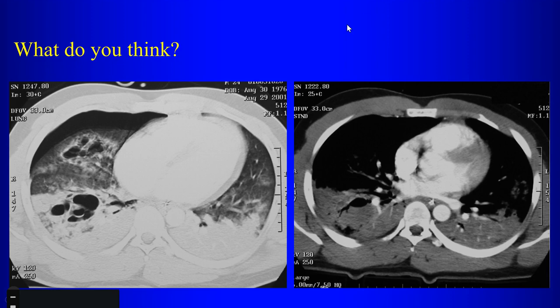So 2 images from this CT scan on this patient. So what do you think the history was for this patient? Trauma, yeah, because there is a big pneumothorax. So what's happening in the lungs? Well, what do we have in the lungs? Layering consolidation. What does the consolidation represent? Blood. So is this normal?